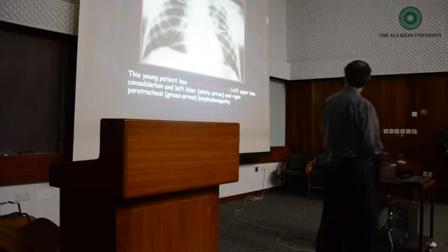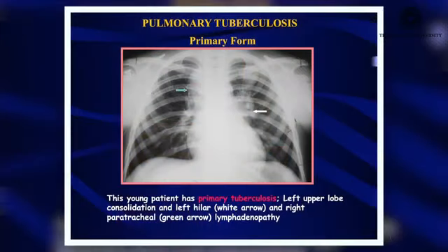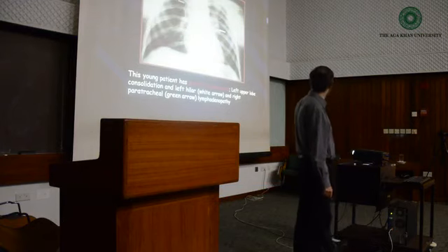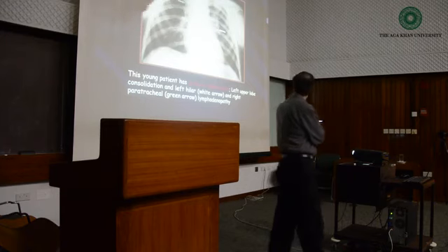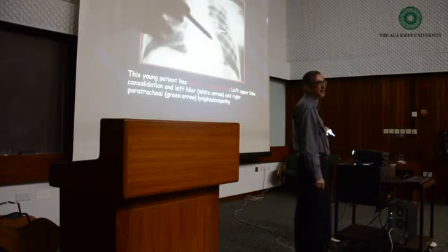Okay, so in primary complexes, first of all, the lungs are infected. So you have a focus here. By the passage of time, the lymph node which drains this part, which is usually in the hilum, becomes big. And lymph nodes, even when they become big, remain slightly lobulated. So can you see the lobulation here? So this and this together form a complex, which is a primary complex. This is a focus, and along with the lymph node, it becomes a complex.